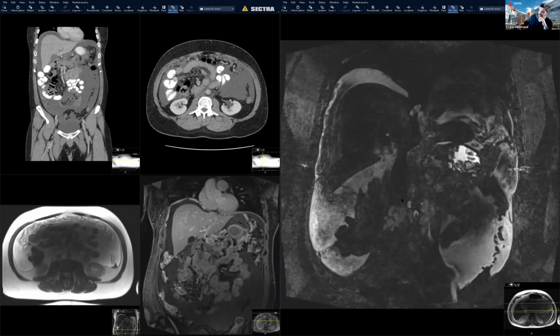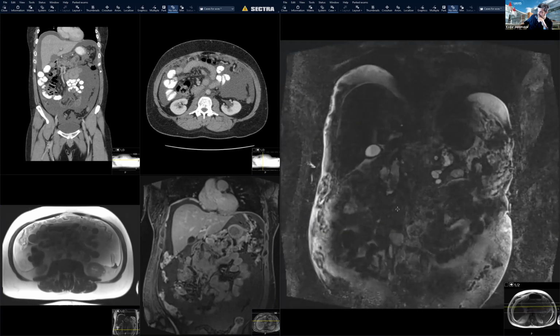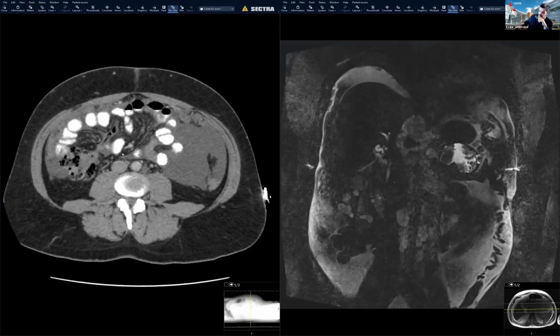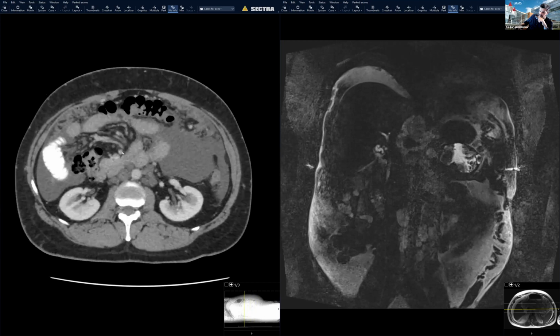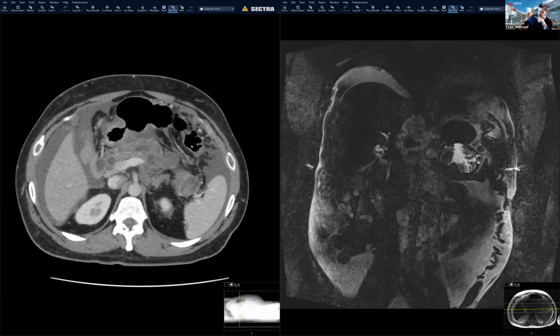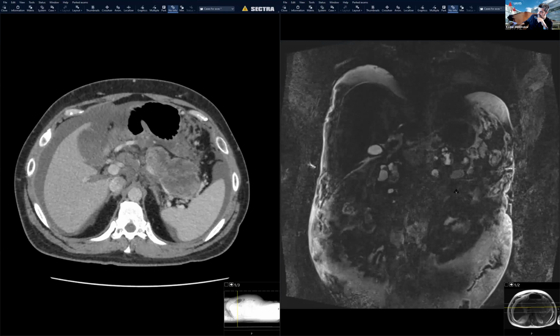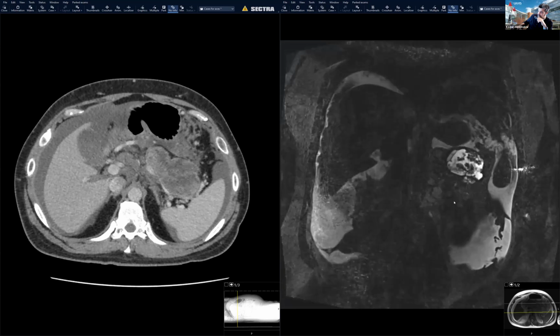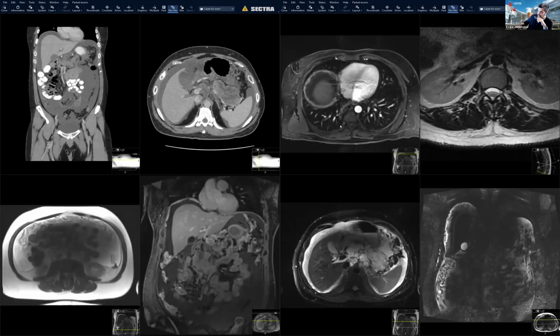So that's exactly what this turned out to be. This turned out to be like the most gigantic IPMN I have seen. And you can see that even here, there are actually soft tissue nodules within the... oh, sorry, going the wrong way. See this? So there are actual nodules seen throughout. What we couldn't see very well here, you can see a lot better here, that it's actually the duct that is dilated. And all these were soft tissue fronds growing within the duct and around the duct. Again, you can see that here.